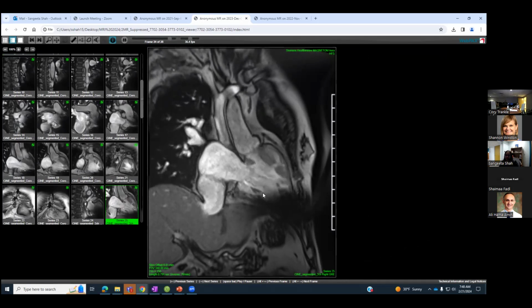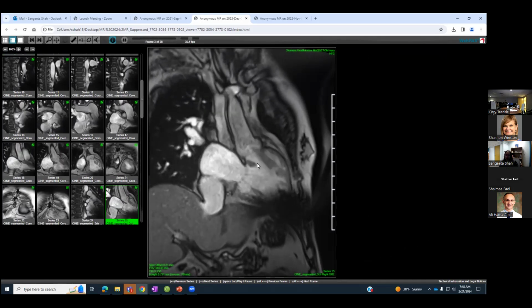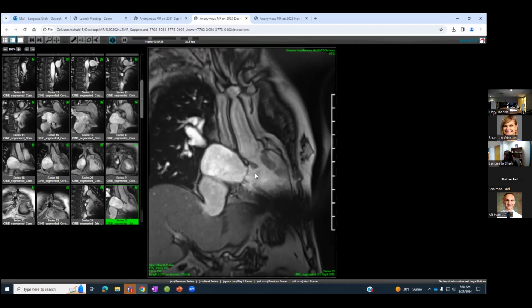So I showed this image. This is your tricuspid valve. This is your systemic right ventricle, and here's your aorta. When you have transposition, you'll see this little nubbin right here, which is muscle. And the reason to identify that, sometimes we don't know what's what.